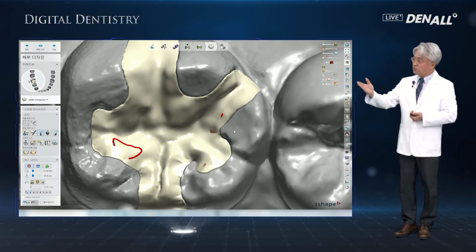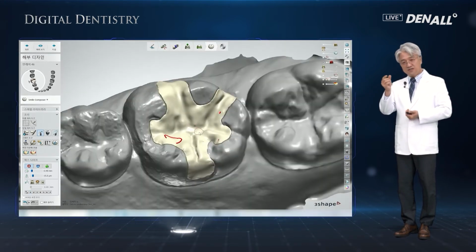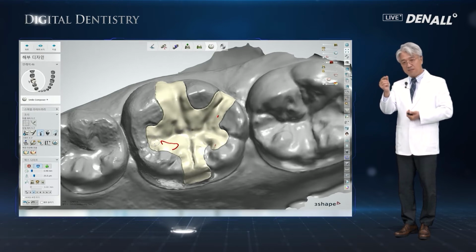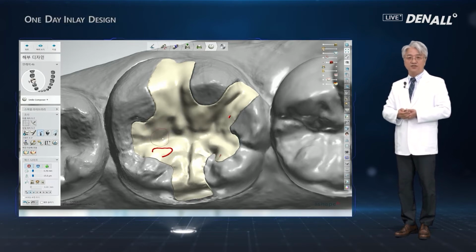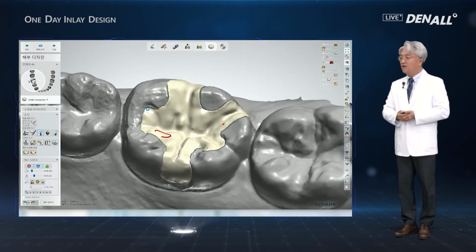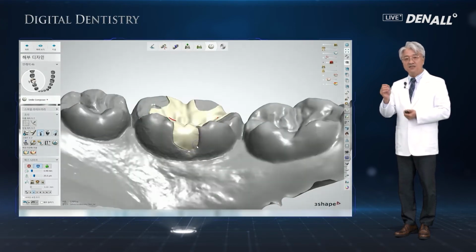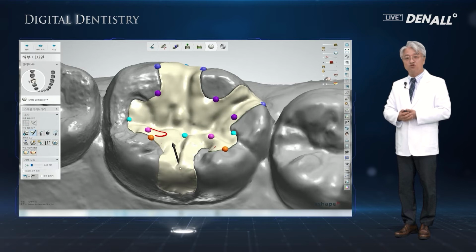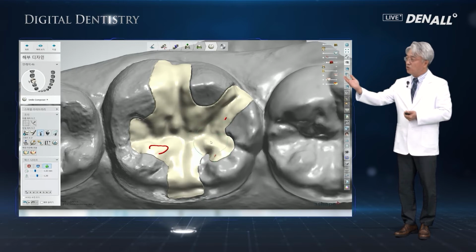So the groove or thickness, the minimum thickness on the software side, if you put in the limit or threshold values in the system first, for ceramics or hybrid resin or other materials, or the material property set values are input, then there will be no problem in creating prostheses in milling. In other words, a stable result can be made in the system.